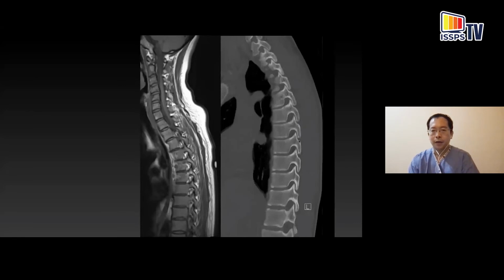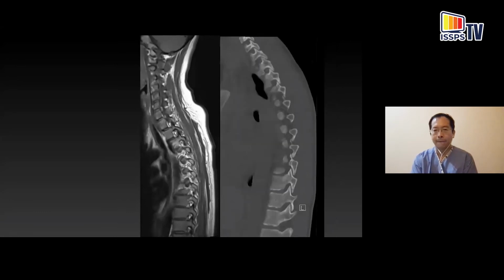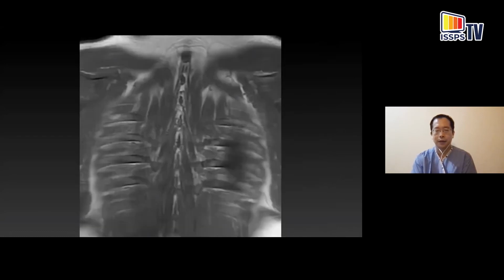And you can see again, appreciate from this beautiful anatomy of the facet joints and how they are orientated in a craniocaudal direction. A more favorable approach for facet blocks if you are using ultrasound guided injection is to go craniocaudal into the facet joints rather than transversely. And just coming out here, you're starting to see the transverse processes all projecting outwards. Here, more facet joints resembling the lumbar spine with very short transverse processes.